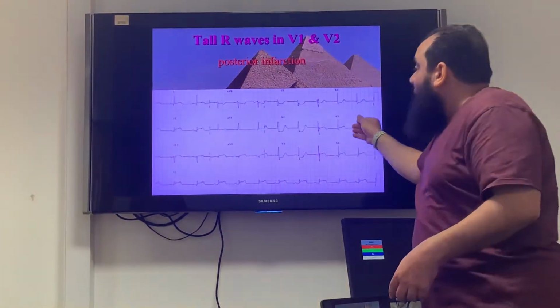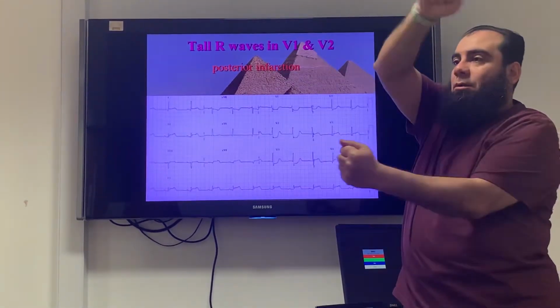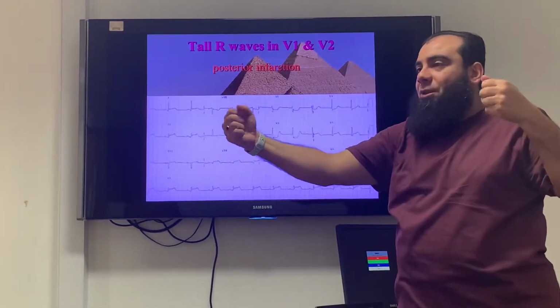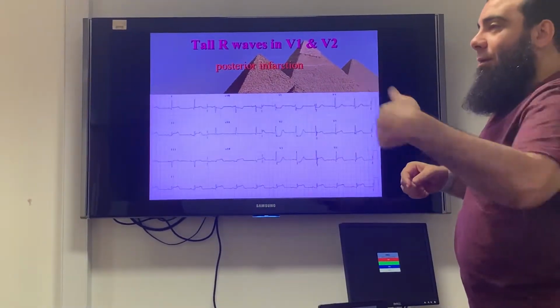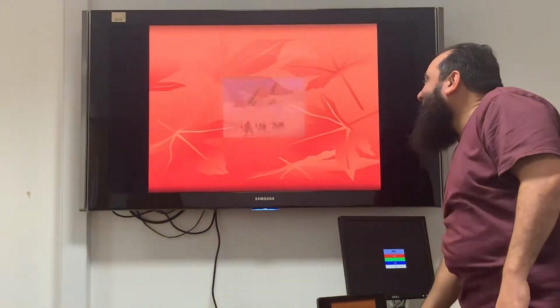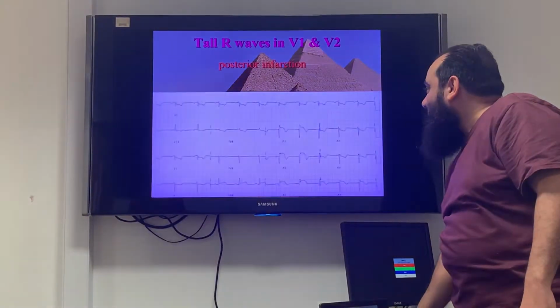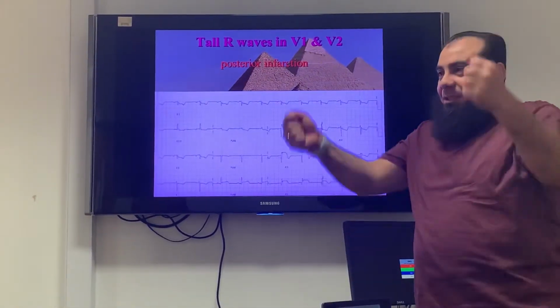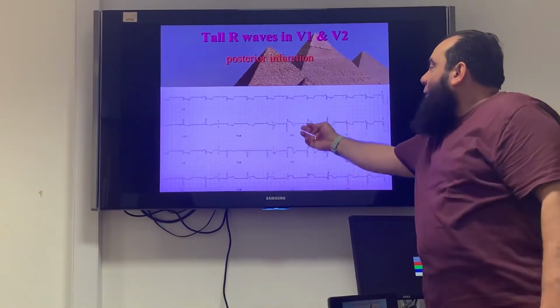The first one, to catch that ECG in our hand, rotate it, get a mirror image. It means rotate, then someone to look from the back. I have done it. Okay, I rotated it, then I swapped it this way. What can you see here?